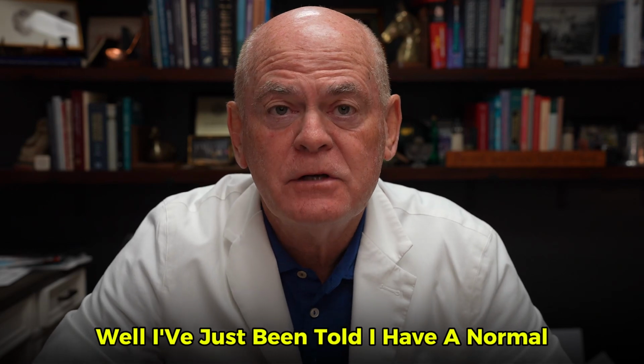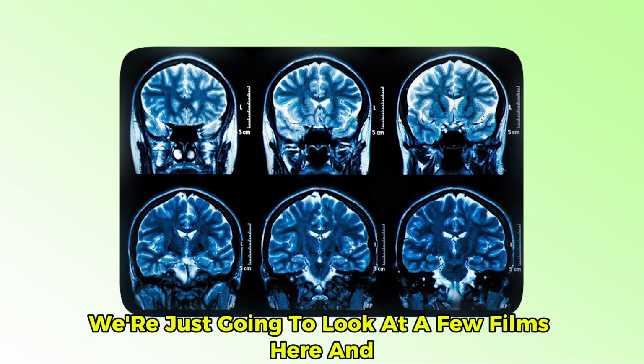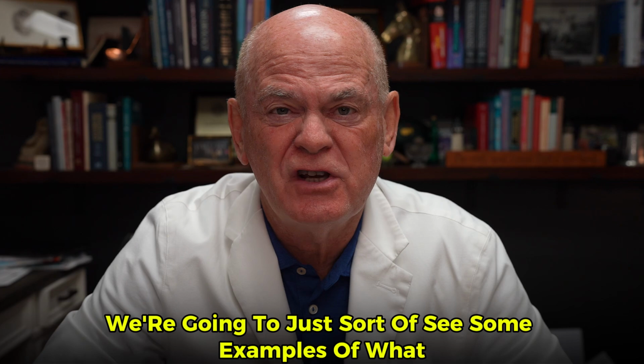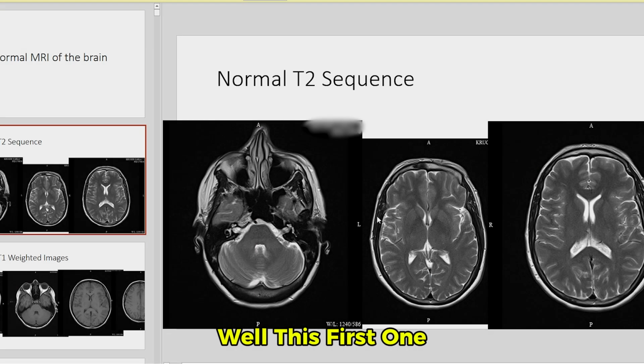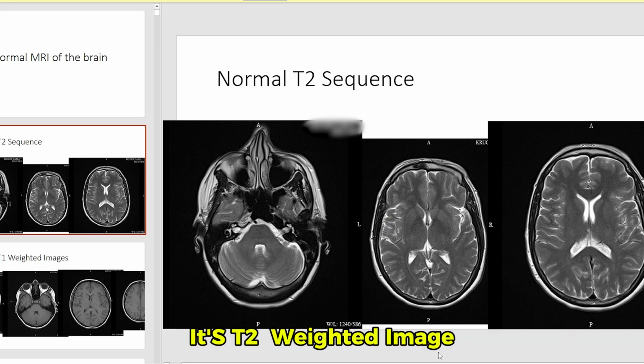Well, I've just been told I have a normal MRI of the brain. So what does that mean? We're just going to look at a few films here, and we're going to see some examples of what is normal. Well, this first one is the sequence that most of us like the best. It's a T2 weighted image.